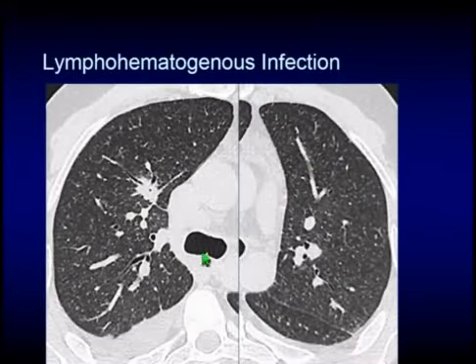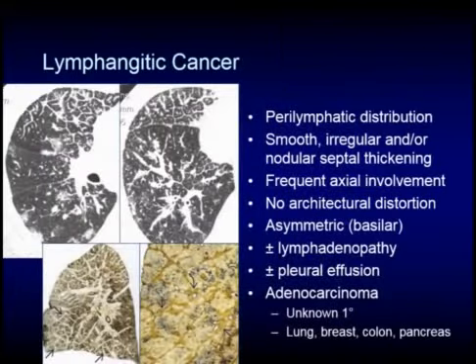And here, again, in another case, we see some effusions. But look at all these nodules. When you look from the medial lung to the lateral lung or top to bottom, it looks all fairly homogeneous. The nodules are all over, fairly equal throughout the lung.